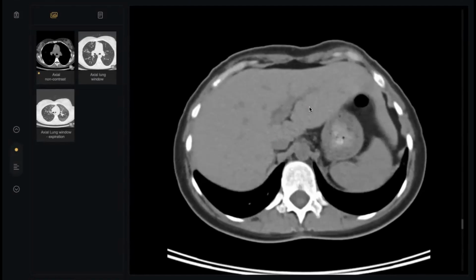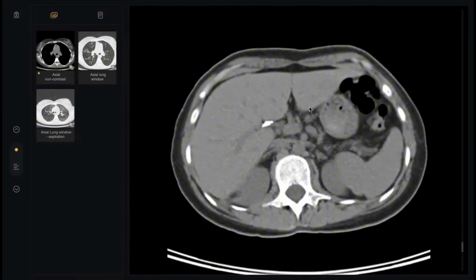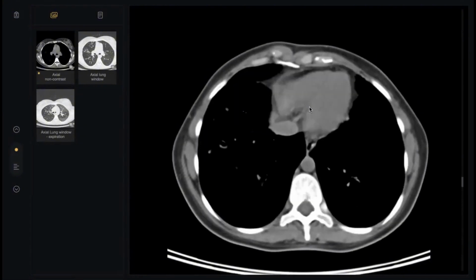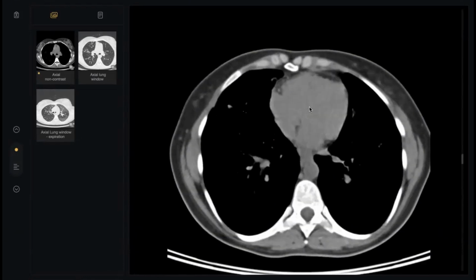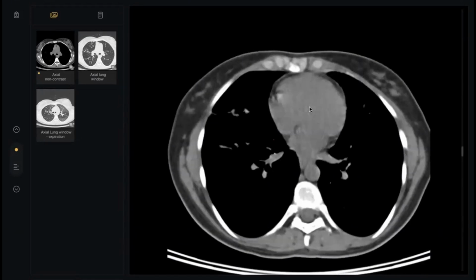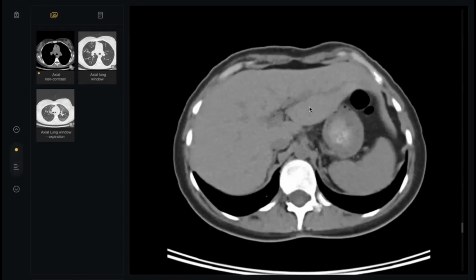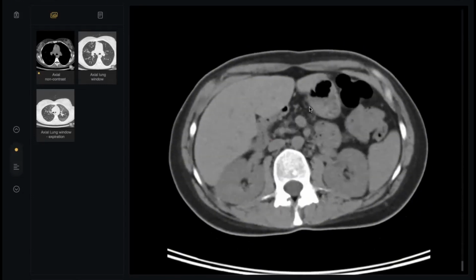The pancreas showed fatty infiltration or fatty replacement. It was mainly an abdominal CT with a little bit of bronchiectatic changes. So in a child with liver cirrhosis and portal hypertension like this, pancreatic fatty replacement is cystic fibrosis until proven otherwise.